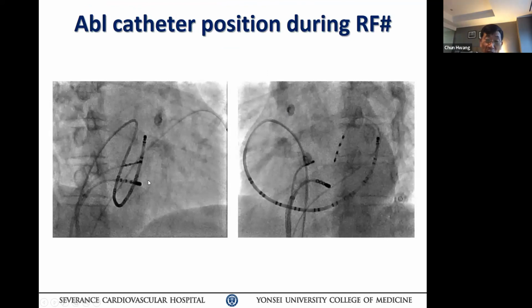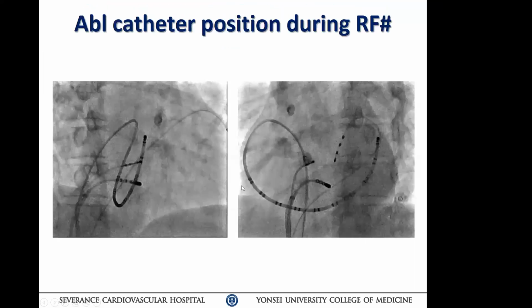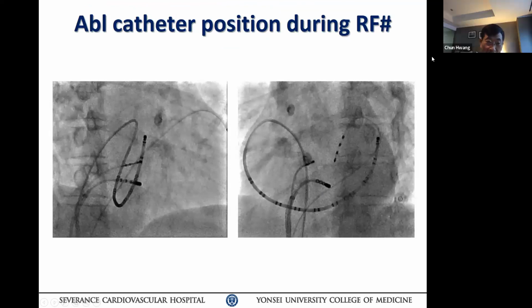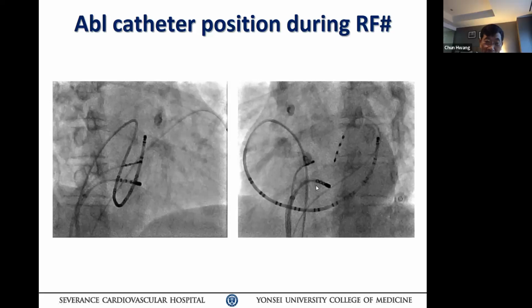So is that the mid septum or is it posterior septum? Looks like almost a low septum position. Posterior septum. Okay. So either right side, I assume, not left. Yes, right side posterior septum. It's almost like the roof of the CS to me. Okay. All right. Go ahead.